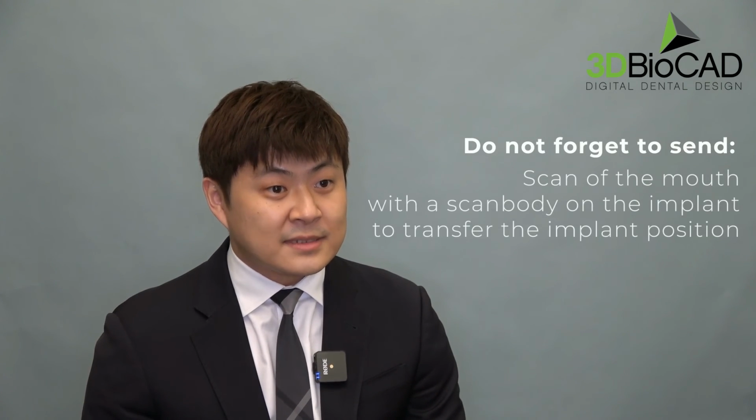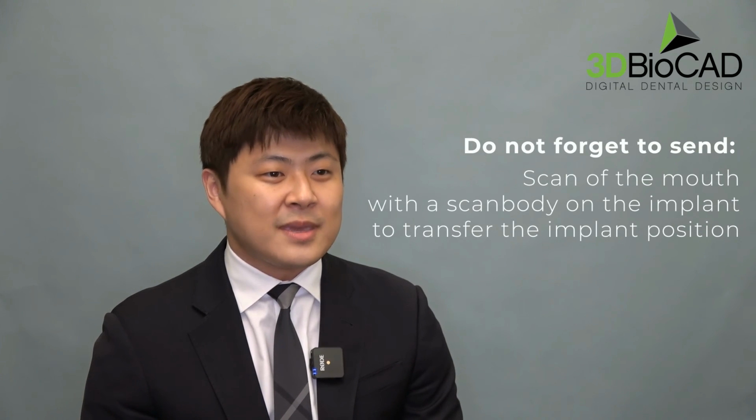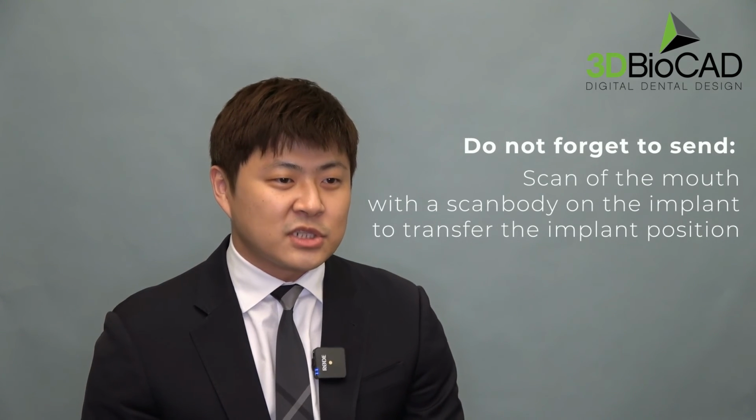And of course, the third scan that you need to send to the lab is a scan of the mouth with a scan body on the implant to transfer the implant position to the lab.